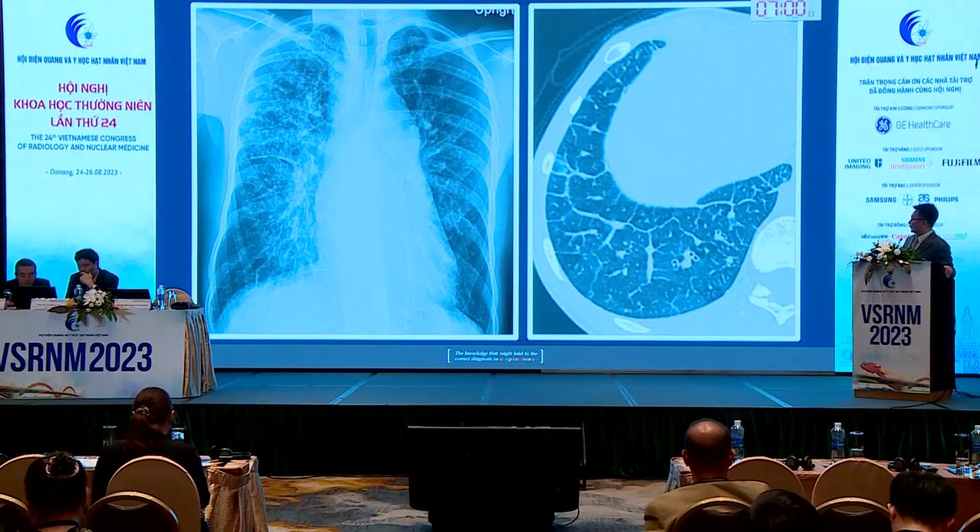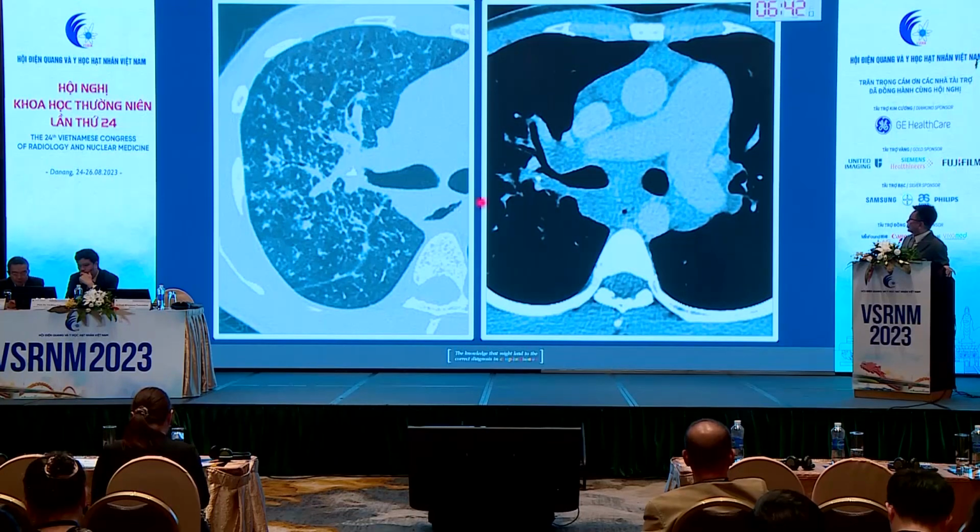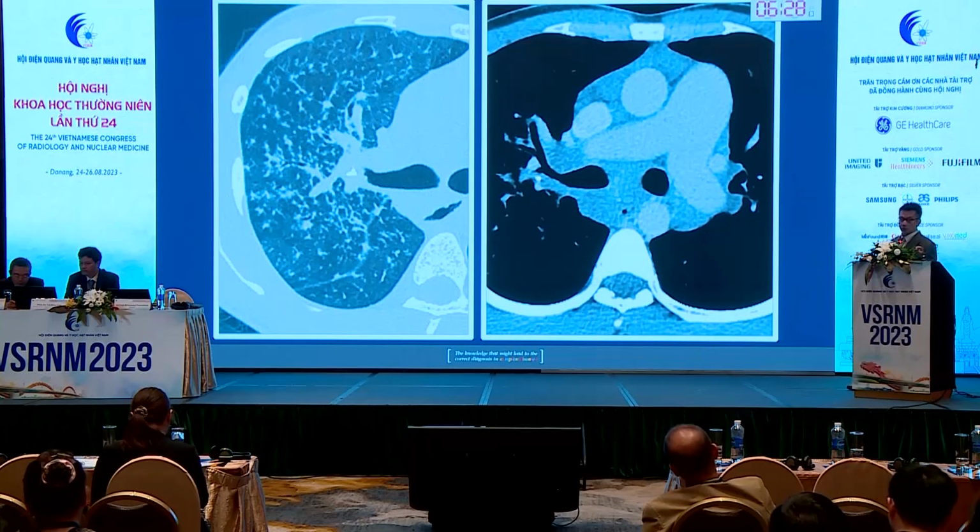And in the lower lung, CT nicely showed smooth interlobular septal thickening. This is not tuberculosis either, because tuberculosis will appear in the upper lung, with no involvement of the lower lung, and smooth interlobular septal thickening is not a finding of tuberculosis. And comparing to the mediastinal window, you can see that with the nodular upper lung there is also mediastinal lymphadenopathy. So this is sarcoidosis, because perilymphatic nodules are common in 3 diseases. One is sarcoidosis, the second is silicosis, and the third one is lymphangitic metastasis.